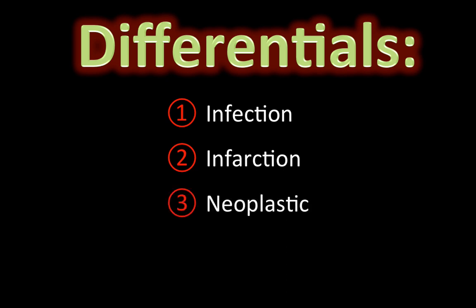Could this be a neoplasm? Now, the acute presentation would argue against a neoplastic process, and the multifocality makes neoplasm less likely. However, there are rare cases that are described of bilateral primary brain neoplastic involvement in the context of something known as gliomatosis cerebri, which is very rare as well.